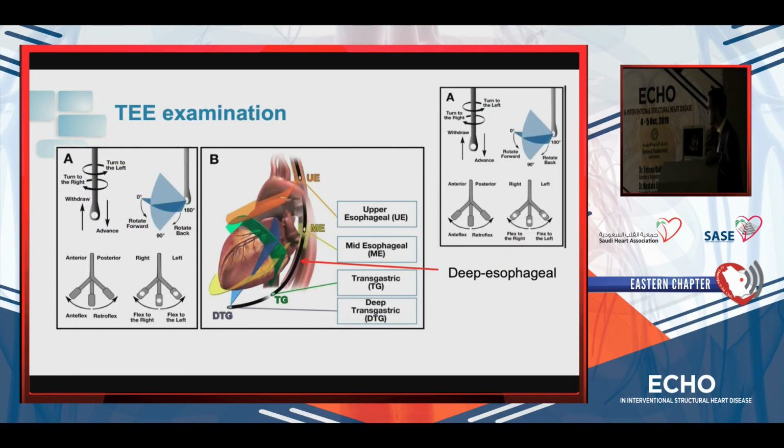So we have different views we can use, and we've shown this already. We have the upper, we have the mid, we have the transgastric.